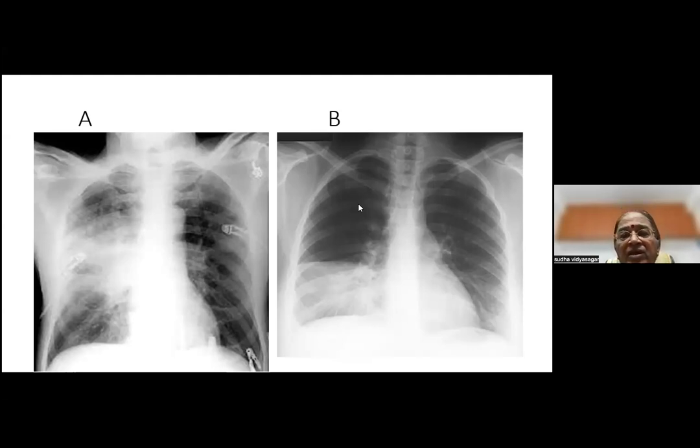Okay, A is middle lobe consolidation. Somebody says B is parapneumonic effusion. Okay, where is this pneumonia? Let's get this straight. B is the easier one. Let's go for B. Where is the pneumonia? Is it a middle lobe or a lower lobe? Middle, isn't it? Your diaphragm is seen, the heart border is not seen, so middle lobe. So we got that right.